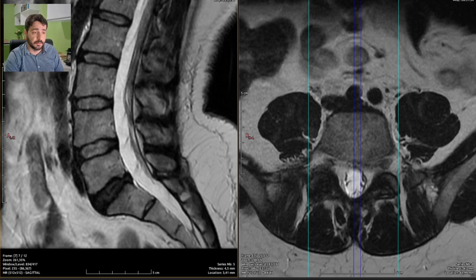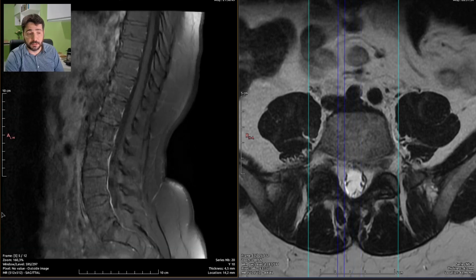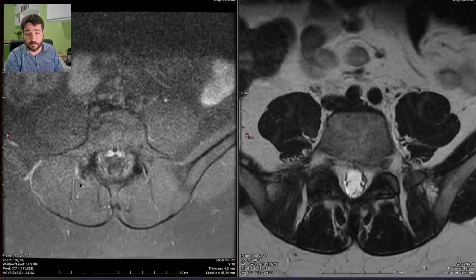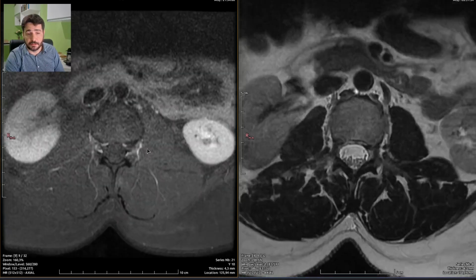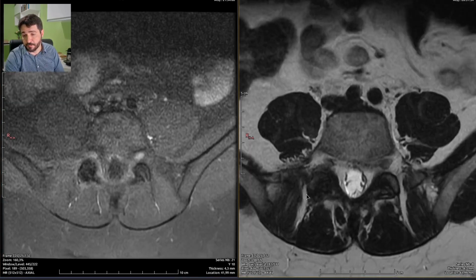So they also used contrast enhancement, which makes no sense, but it was requested by the physician, so they did as requested. So contrast enhancement is unremarkable because it is supposed to be unremarkable.